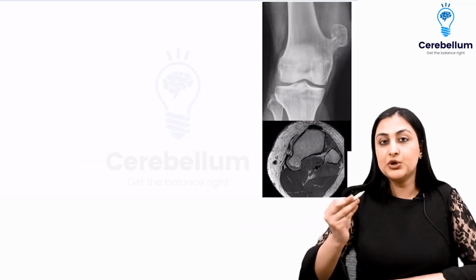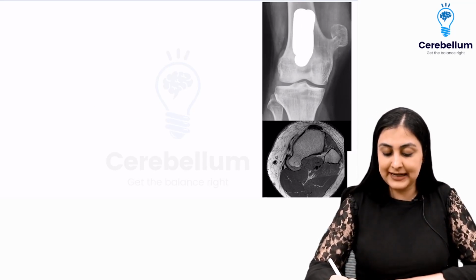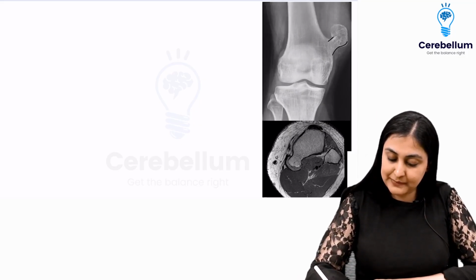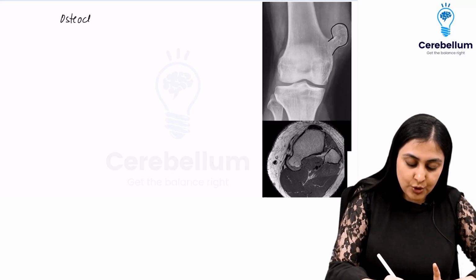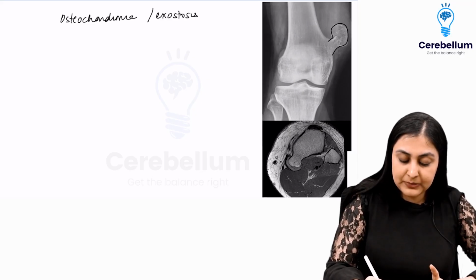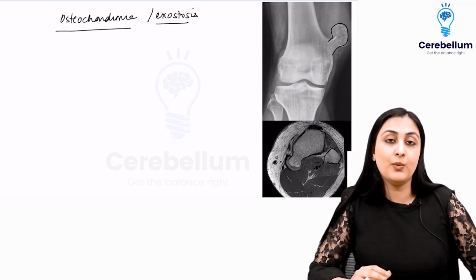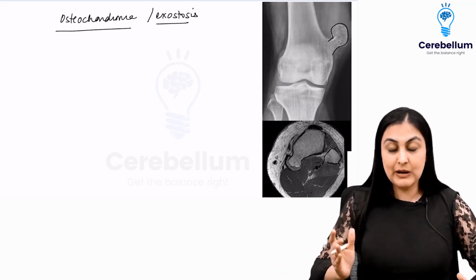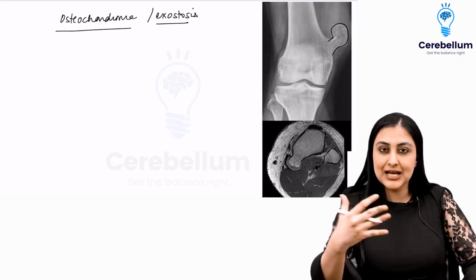Now we're talking about a bone tumor which is growing away from the bone. So far we had the epicenter inside the bone and then if it was aggressive it would spread out. But this here is a lesion which is primarily growing as this mushroom here. This entity is osteochondroma, also called as an exostosis. A lot of people believe it is not even a true bone tumor. Okay, so they consider it to be a response to some sort of a congenital vascular accident. Okay, so this is an osteochondroma or an exostosis which is growing outside. Exo meaning outside, growing outside the bone.